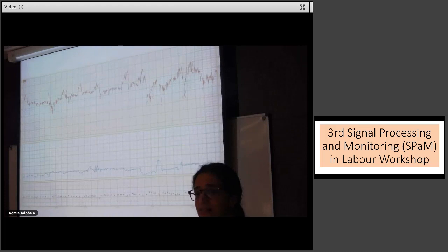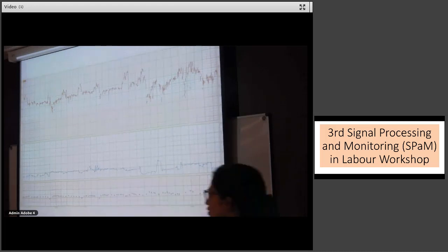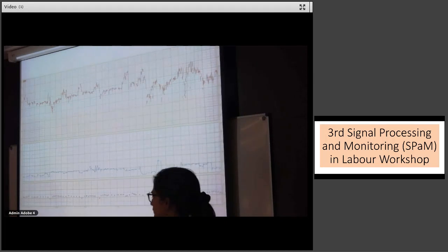The other thing that's important is that the mother can move, or if you don't move the TOCO for a while, normally you stop registering contractions. You always want to look at what's below, in this case, the TOCO channel. And if you look at those accelerations and then drop your eye to the TOCO channel, even though they're inverted, you can see a one-to-one relationship between an event on the contraction channel and the obvious acceleration. And that's what you're here to do, to find the relationship between those two.